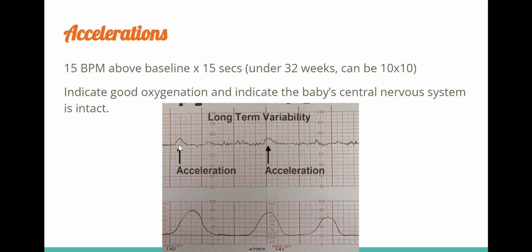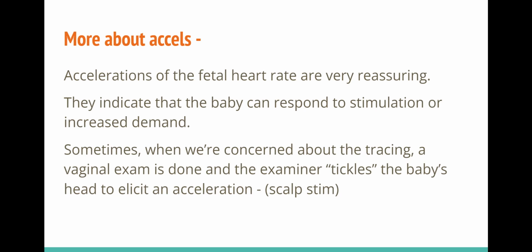But these are accelerations. They are at least 15 beats above the baseline. And they last, this one lasted about 20 seconds. This one lasted about 25 seconds. So we know that that baby has good oxygenation and their central nervous system is intact. They are responding to a demand for movement or some other need for more oxygen.